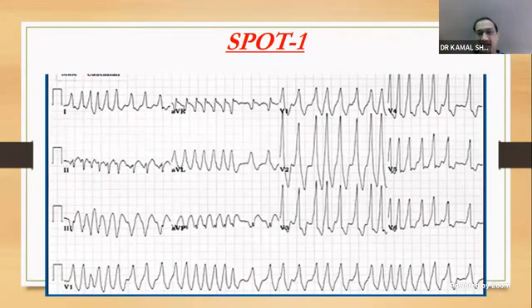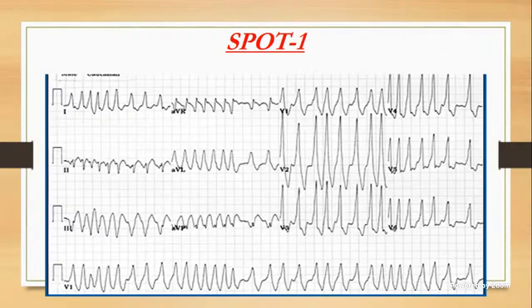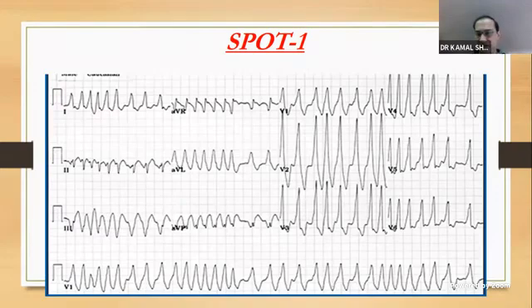So is there any rough rule, though it's now been proven otherwise, that the duration of QRS complexes, how wide the QRSs are, is usually in favor of AFib with pre-excitation rather than VT? Is there any cutoff? Can VTs be 140, sir? No, 140 you can always get. VTs can be 140. VTs you can get at 180 and above.